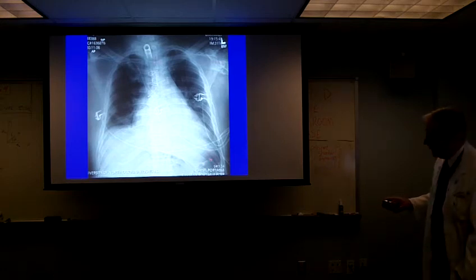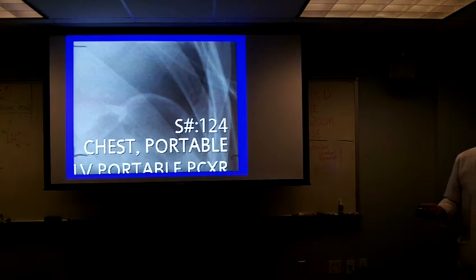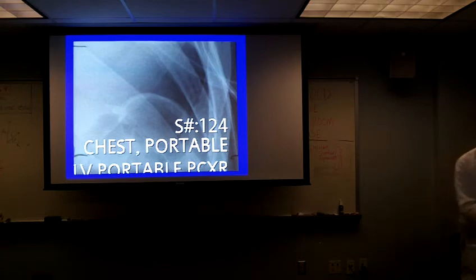Also, if you look down here, here's what we call the double wall sign, and I'll cone in on that. This is air in the lumen of the bowel. This is air outside of the lumen. Can't see that bowel wall unless there is free air.